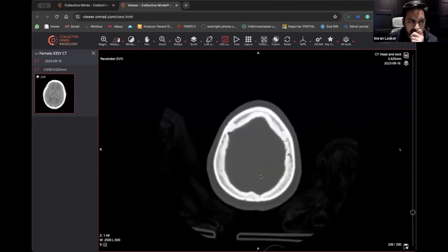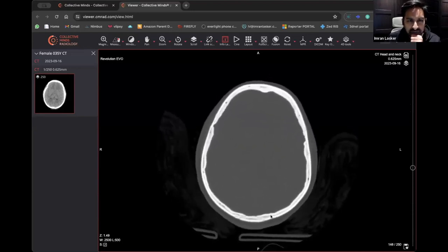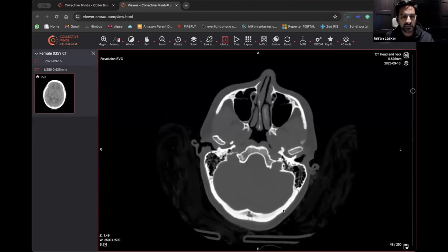And then someone has said it, well done, you picked it up. So if we come down, come down, come down, we'll have to see if we can find it. Yeah, can you see that? So well done, someone's picked it up. So just here, just right there, I'm going to just draw right around there. Can you see that? That is actually a fracture.